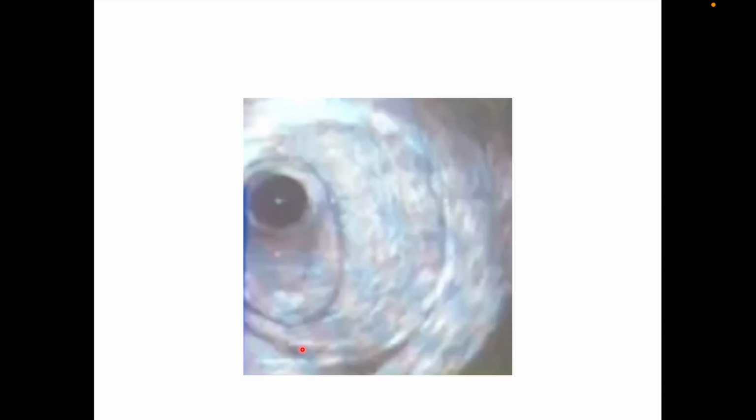So this is an interesting one. If you look at this, there's the IVUS catheter, there's the lumen, and then the white would be the intima. Then the black circumferential line is the media, and outside this is the adventitia. But if we consider it the way I've said, then what is this black line that's going in a circle here all the way circumferential? Is that media? If this is media, then this is adventitia, then what is this black line? So this is lumen, intima, this is media, but both are media because it's the inner and the outer lining of media, and the rest of the media is full of organized blood.